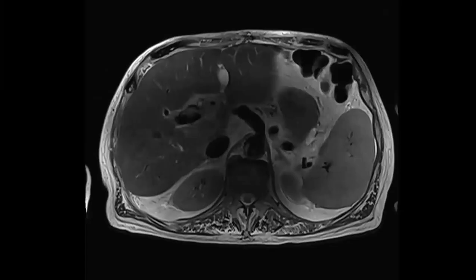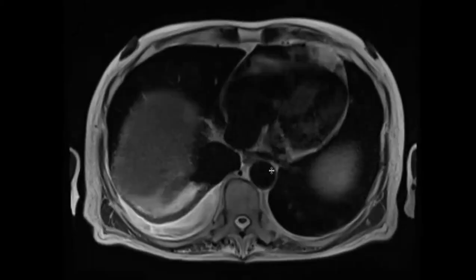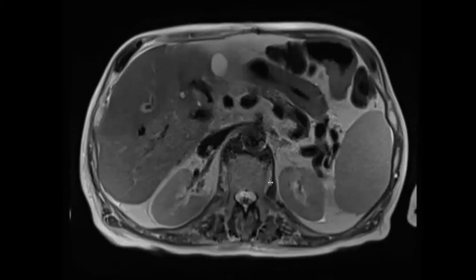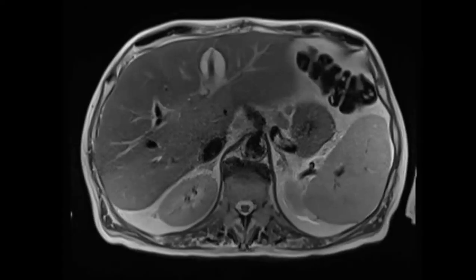Right there. On the immediate one, it wasn't really obliterating all the soft tissue fat. Correct. And now you're getting a lot more soft tissue. You've seen a lot more. So this is 2 months after transplant, and you can see there's progression of that.